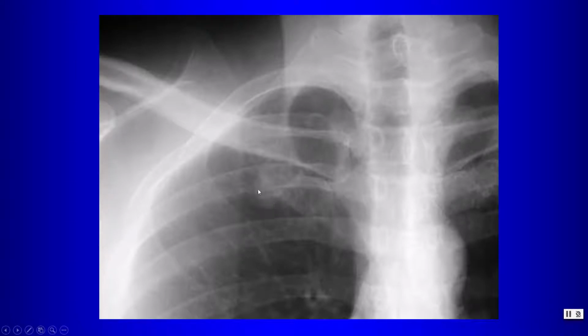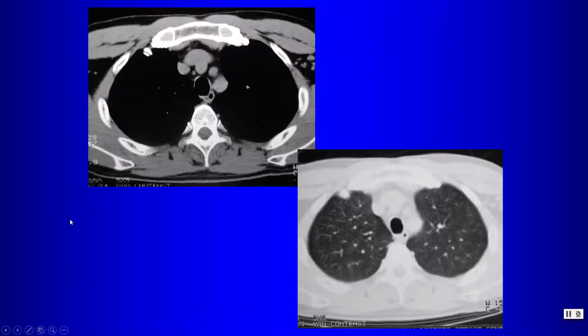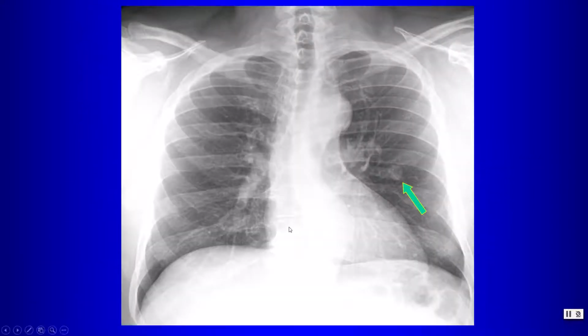Some clues are that the borders disappear exactly where it is touching the rib, and often this is dense, just like calcium, and this can be confirmed on CT. Sometimes even on CT, because of partial volume averaging, this might look like a calcified lesion within the lung parenchyma, when this really represents just costochondral calcification of the anterior first rib. So that's called a student's tumor.